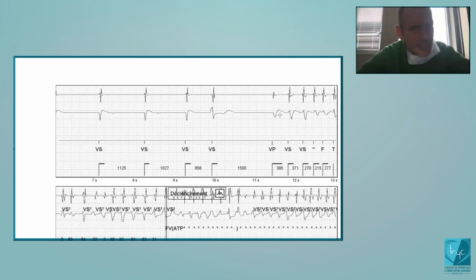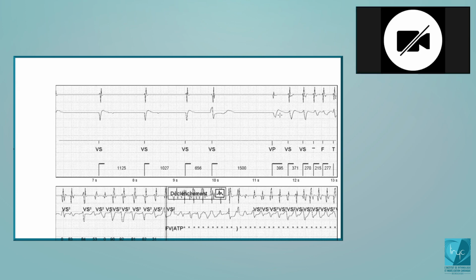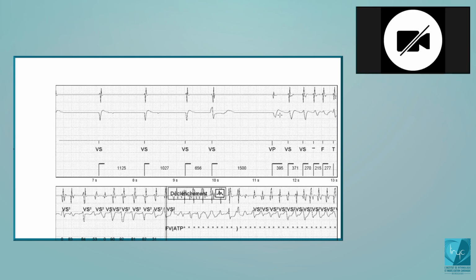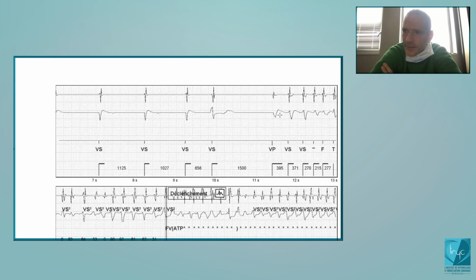What is the discrimination channel? The discrimination channel is a unipolar channel used for the discrimination based on the morphology. What are the two choices? You can reprogram it if you want. The coil, and the tip.